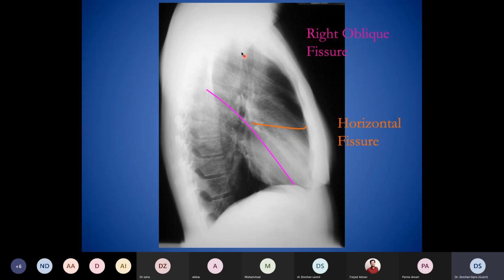Actually, for the left lung, the whole of this part of lung above the oblique fissure is the upper lobe, while posterior to this oblique fissure is the lower lobe, and it's rather oblique. The right lower lobe, even the part is quite above the nipple level over here, for example, and the part of the upper lobe is quite below the nipple level over here as well. But on the right side, we have a middle lobe as well. So the middle lobe projects in a rather lower area, and anterior to the right lower lobe.